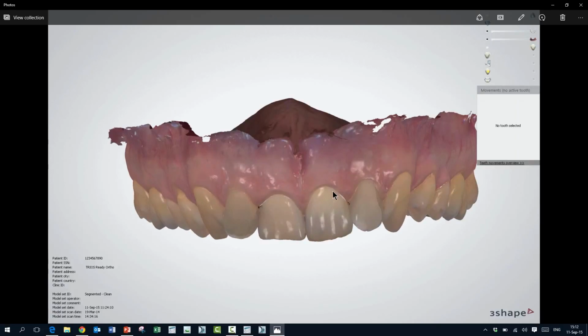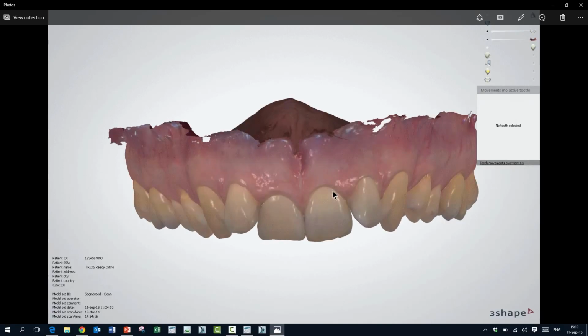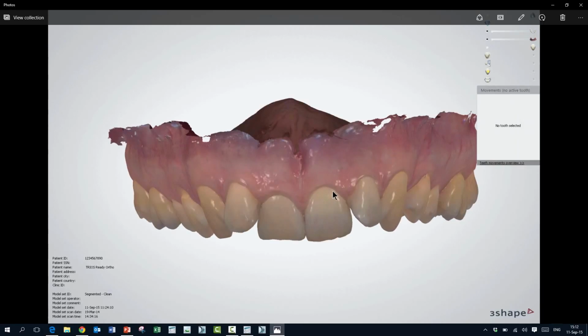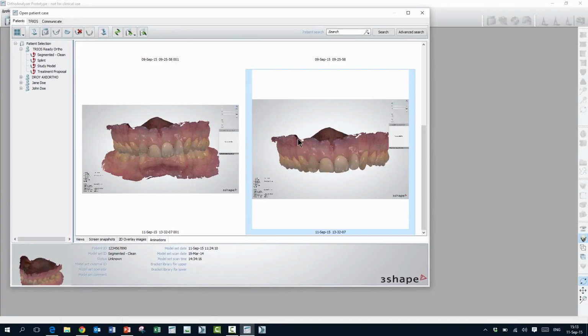By the way, like a lot of GIF files out there, this is on a continuous loop. So when you want to show this to your patient, you don't have to worry about whether you have time to show it or not. It will simply go on an indefinite loop. Let me close the file again. A few more things I want to show you: when you right click the file, you have an option to choose another program to open it with, or you can use save as, and then you will be able to save that GIF file on your local PC.